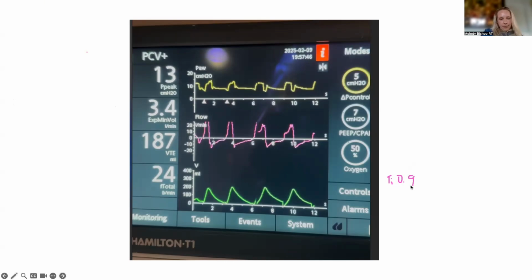So my initial thoughts: let's try to break this down breath by breath. So let's go here, and it's not straight. I'm using a mouse. For everybody watching this, this is the dude that gives me grief when I send him my drawings of waveforms. This is what a mouse does. This is much harder. I'm doing this with a mouse. This is pretty impressive.